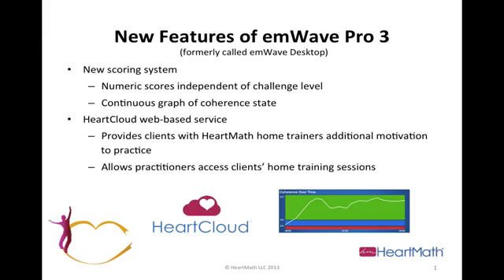Hello, I'm going to talk about the new features of emWave Pro 3, which was formerly called emWave Desktop. We've provided a new scoring system with numeric scores that are independent of challenge level and a continuous graph of coherence state. Also, HeartCloud web-based services, which provide clients who have HeartMath home trainers additional motivation to practice, and also allows you, the practitioner, access to clients' home training sessions if they give you their password.